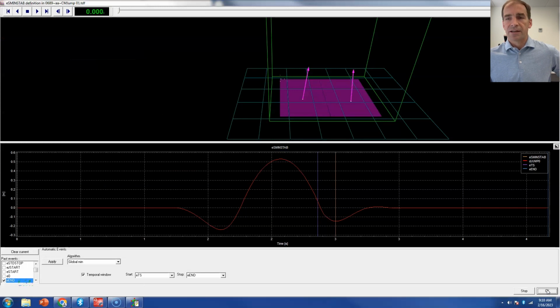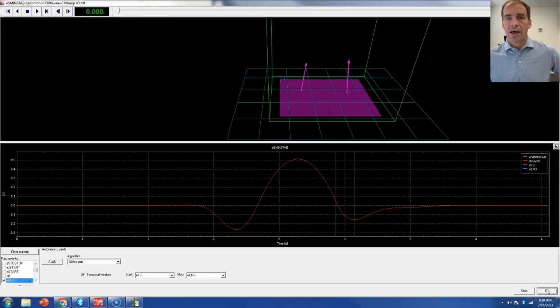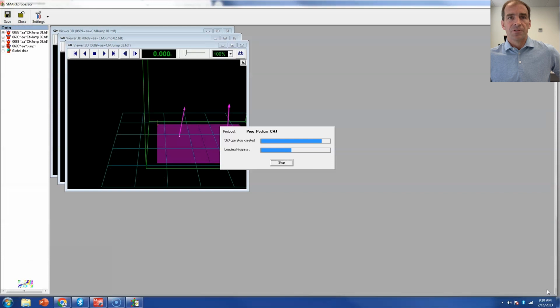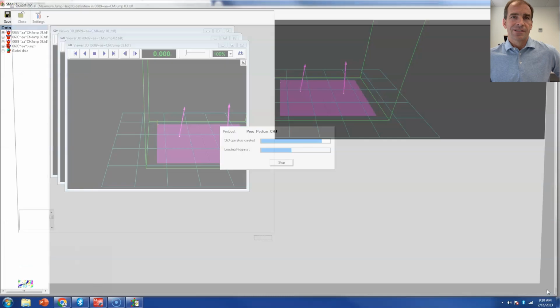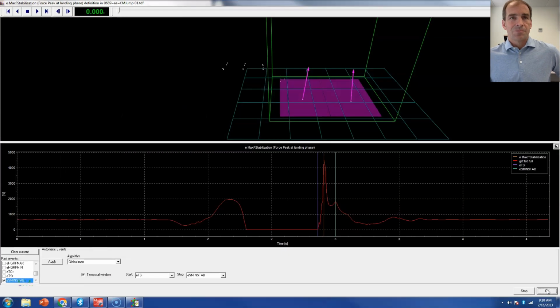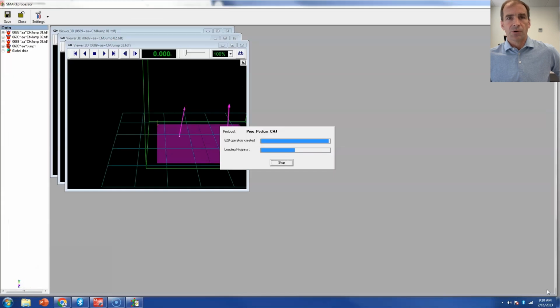And this is now where it's going to calculate, based on using some basic calculus, jump height. And again, all of this should be okay if we've done everything up to this previously. And so you'll notice, again, I'm hitting okay a lot here. It does get a little bit tedious, but to make sure we have accurate data, we want to make sure we're going through all of these. So all of these are okay.